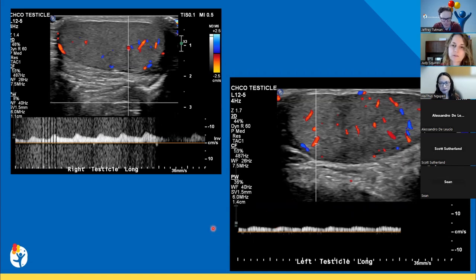Yeah, I agree. The clinical context is super key. Obviously, the Doppler is important. You have to pay attention to what the waveforms look like, but if it doesn't fit the history and what's going on with the kid, especially infants where you have a hard time, the flow is so high resistance and they're moving, I interpret the Doppler with caution always. Right. Yes, definitely a good point.